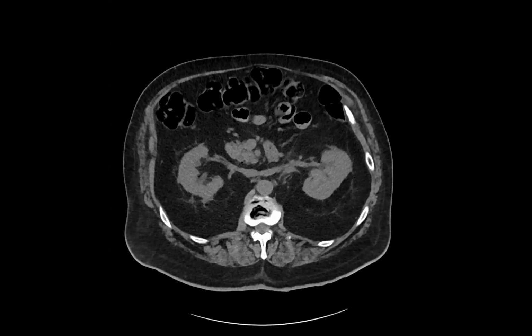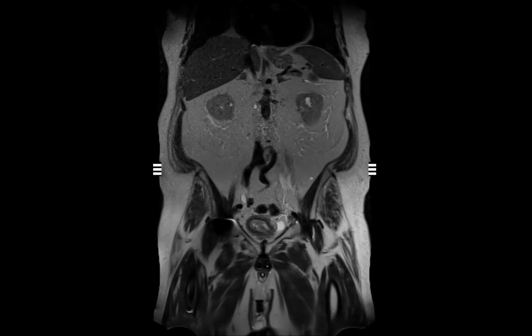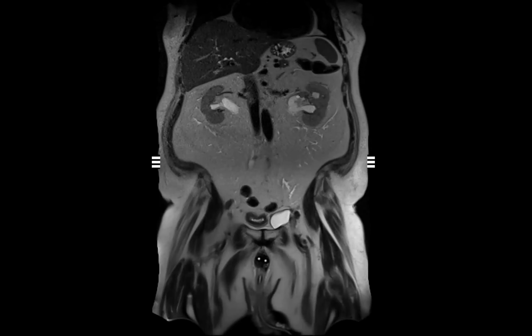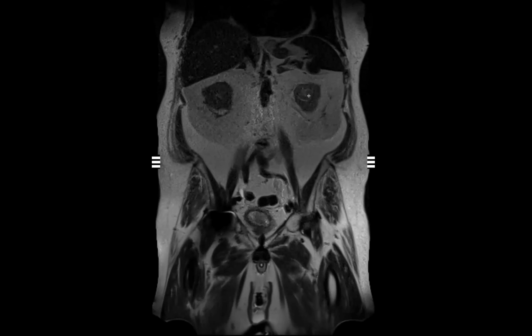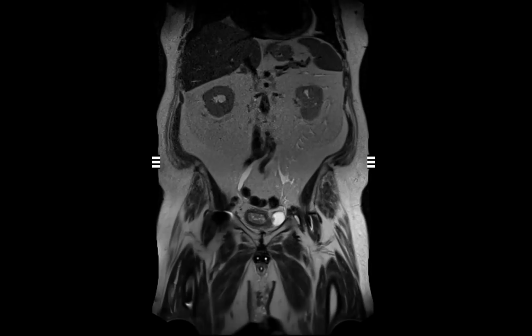And this turned out to be, any guesses as to what it could be, or what your differential would be? Urothelial. Yeah. So the patient had hematuria. This is the MR. As you can see, that filling defect, that density, was this. This was pathology-proven invasive urothelial carcinoma. I think that was an excellent pickup on the CT. Wasn't it very non-con? Yes, looking very carefully at the non-con CTs. Great pickup, because you can see it in retrospect. Yes, you can, and it was picked up prospectively.